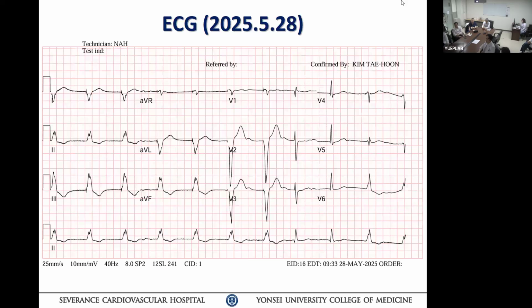Okay, that means what? What possible explanation for that? You have to tell us what's happening in the atrium, as we discussed, and then go down to whether the atrium has any relationship to the QRS. So is there any PR interval, anything? So you don't see any of those, right? So clearly, maybe the atrium is going one way, ventricle going the other way. But there's a narrow complex rhythm, and there is no atrial activity correlating with the QRS complex.